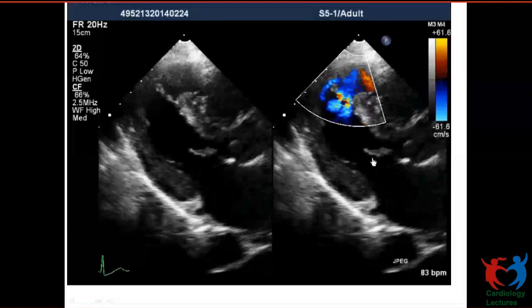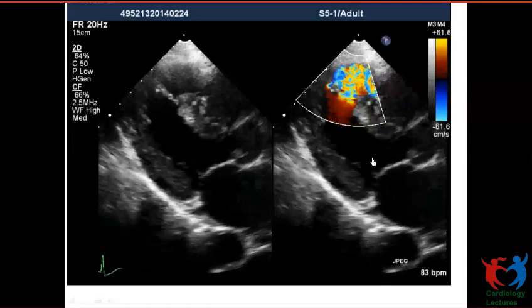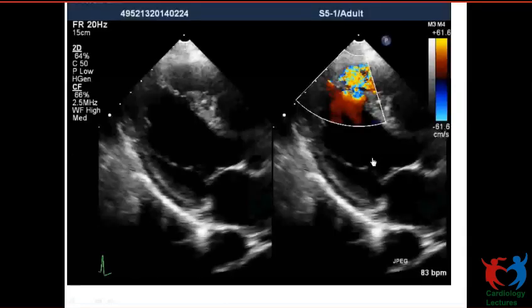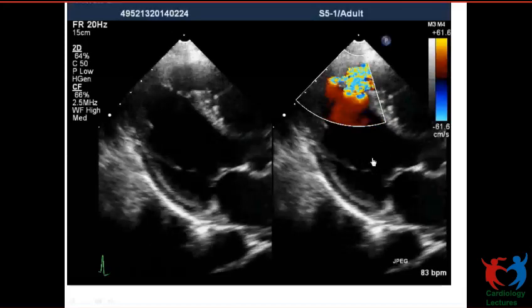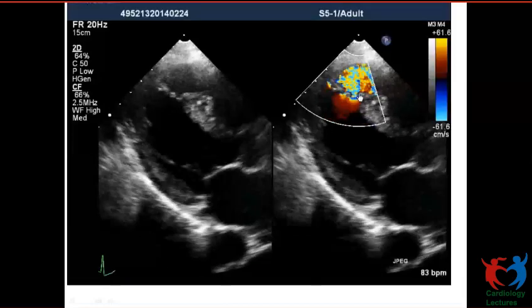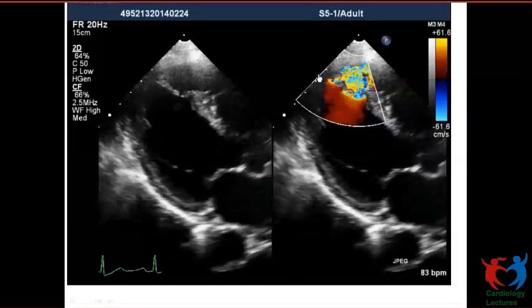What is this? Apical four-chamber view. VSR, ventricular septal rupture. Which part is likely to be the MI here? Anterior wall MI. We can see multiple, no? 1, 2, 3, multiple, yeah, near the apical region, almost mid and apical. So which wall MI is likely to be?